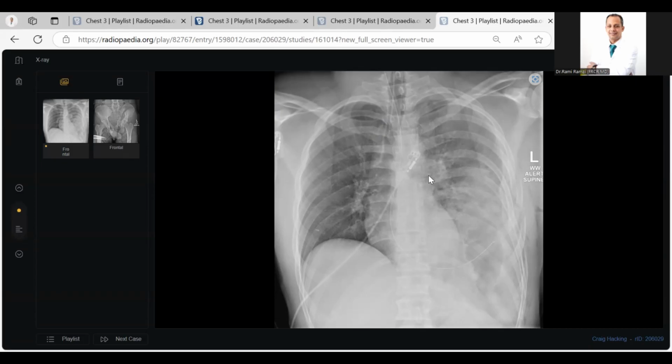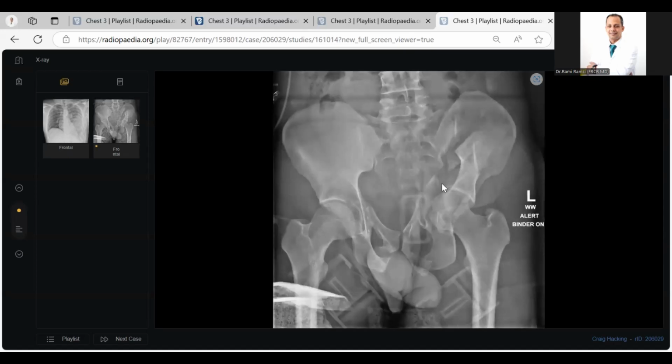You did very well. You told me you're talking about the hemodynamic stability, and then you talked about the cardiac contractility. You did very well. Just when I show you this, I wanted to alert you about something in the pulmonary artery. This is also the fat embolism involving the pulmonary and the brain, both of them, and especially in a polytrauma patient.